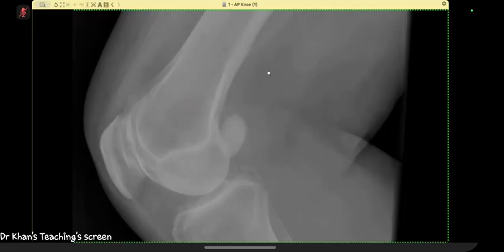If the patient has any history of trauma, this can represent an area of myositis ossificans. In my routine practice, I would compare it with any prior X-rays to check if this was present or if there is any interval change in the calcification and density. There is no history of trauma and there is no previous X-ray. In an older patient, I would also be worried for any sarcomatous transformation with calcification in it.